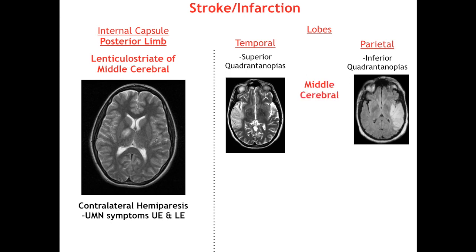So remember, to distinguish between parietal and temporal areas, look for the butterfly. Notice how it's visible on the right image for the parietal, but not on the left. Only the third ventricle and posterior horns are seen in the left image.